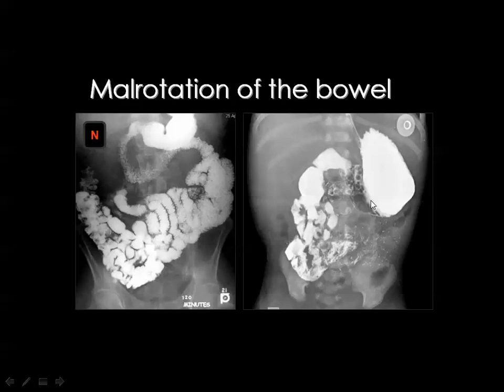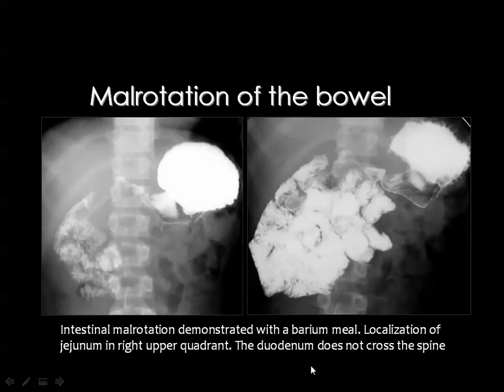This may be absolutely asymptomatic and does not cause any trouble to the child, but it is a feature that can be commented upon on the barium study. This is the normal appearance. You see the duodenum, and you see the site of the ligament of Treitz is to the left of the spine, as you can see here, and these are the rest of the jejunal and ileal loops.